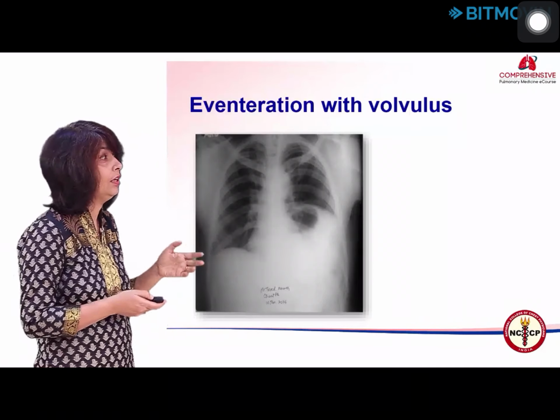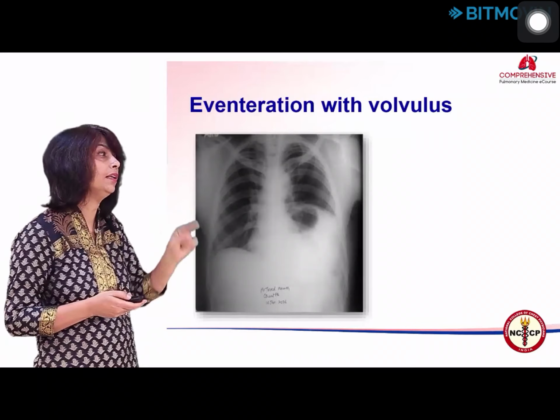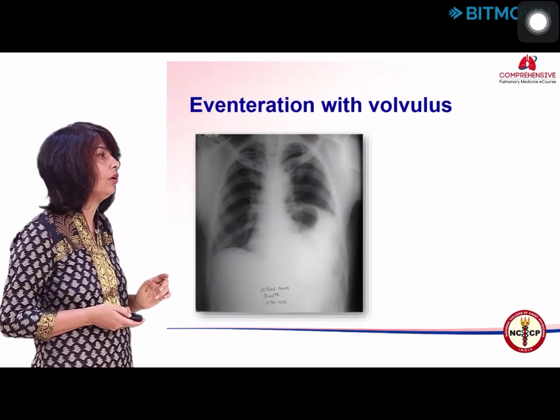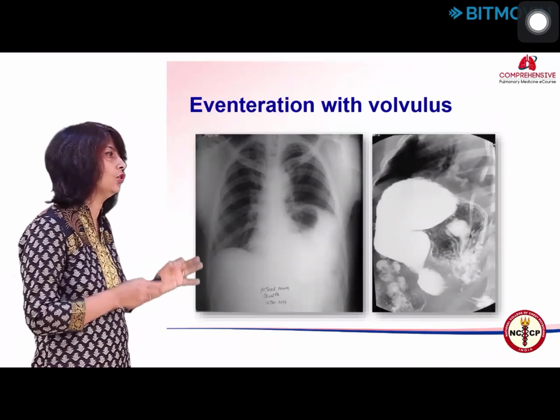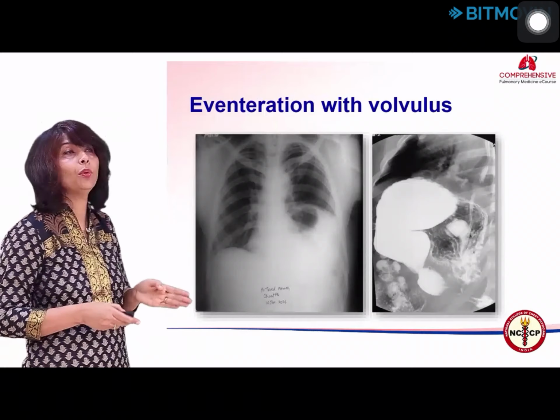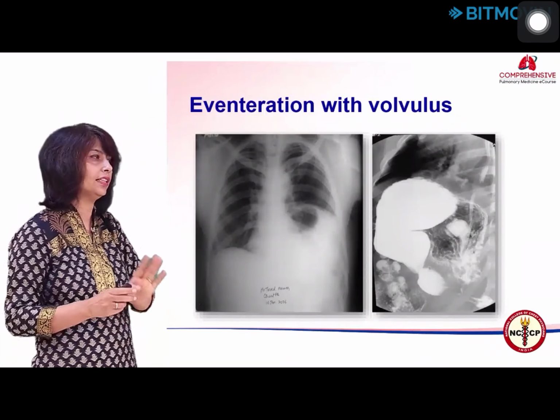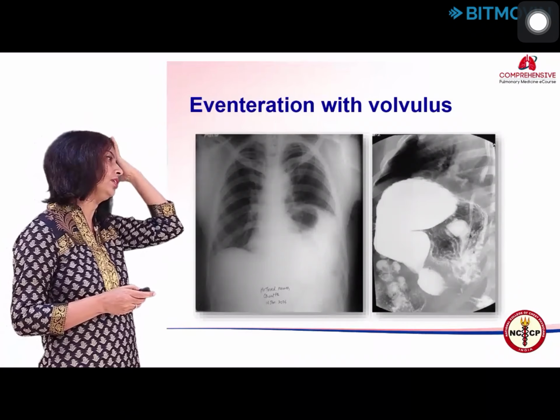So we can't tell. We have this air, but whenever you have air, remember it can either be air in the lung or it can be air in the stomach. Many chest tubes have been put in casualty on this mistake. The latest one I saw yesterday only, the chest tube was not put.